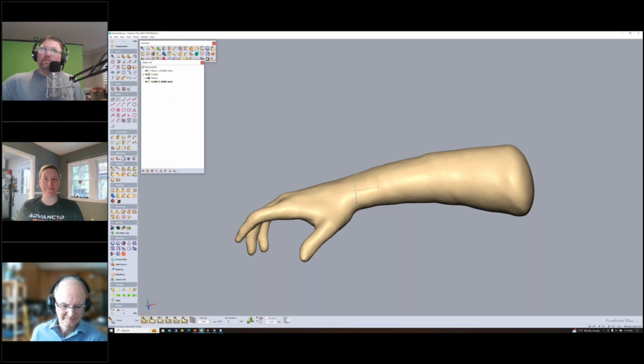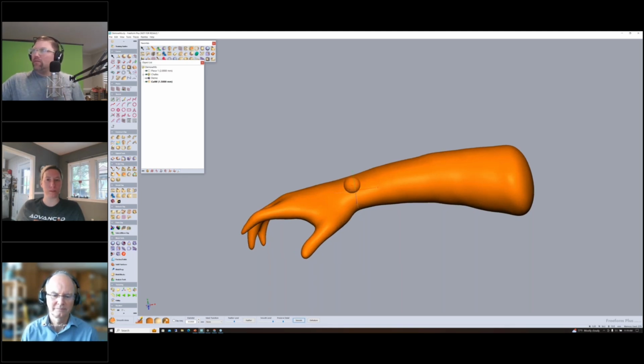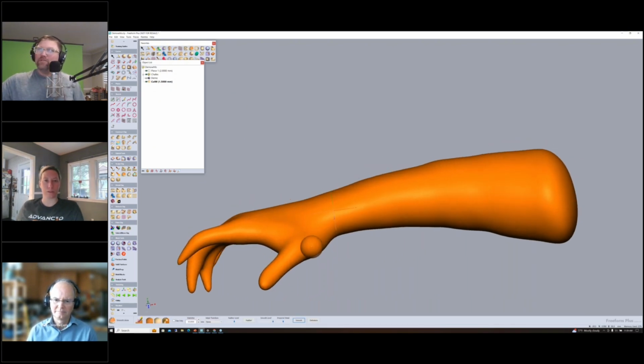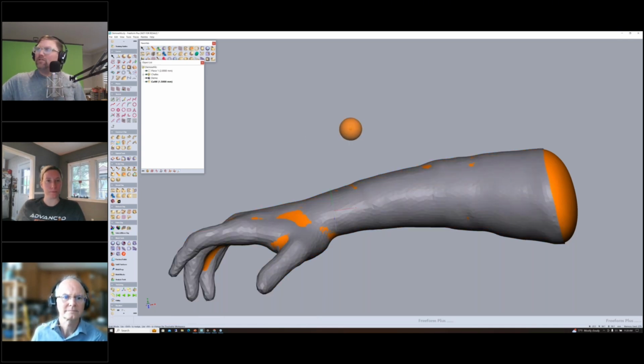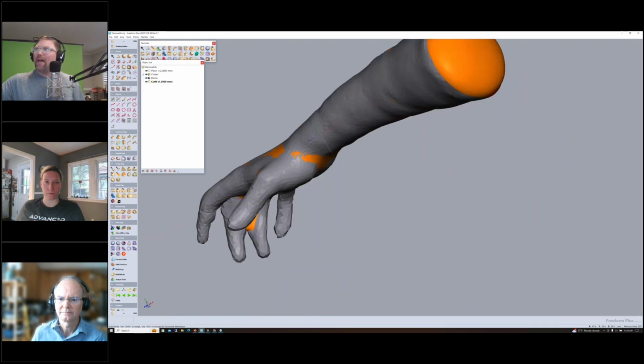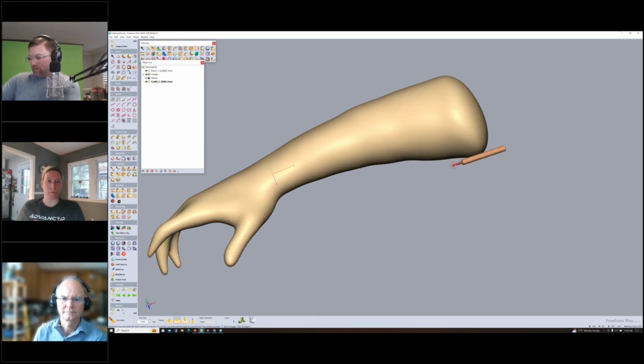So what I'm going to do is I'm actually just going to smooth this a couple times. And you can kind of see that we've smoothed it, and we've started to take some of the lumps and bumps out, but we've got some shininess, and that's what we want. And then I'll bring in this original mesh, and you can see Freeform does an amazing job cleaning up the model without losing or decreasing the circumferences. So I always do that as a check. But we still have some lumps and bumps, and we're going to kind of cruise through this. We're just going to clean.